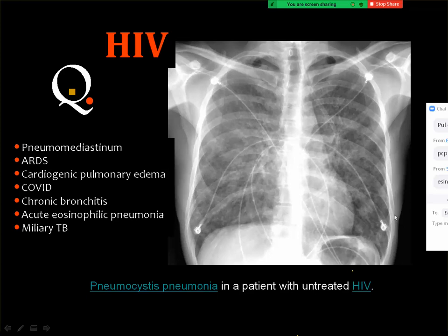Also, because of the immune compromise of the patient, why is this lesion not COVID? Actually, we cannot diagnose COVID for sure from the plain film. But sometimes, because of the pandemic, we assume that the changes in the lung may be related to COVID.